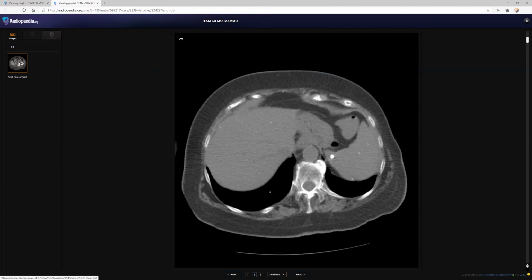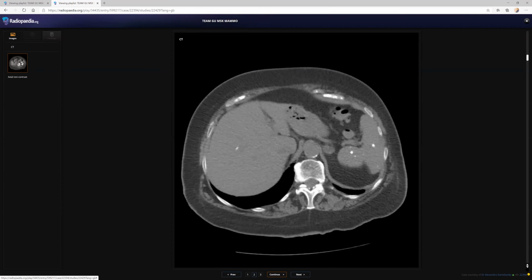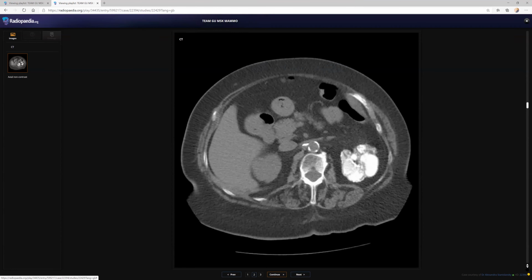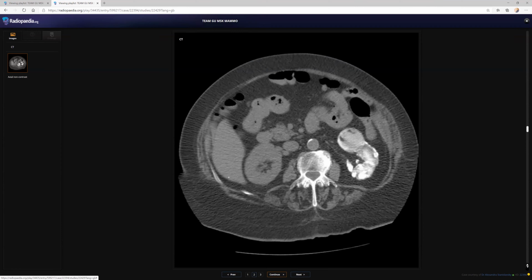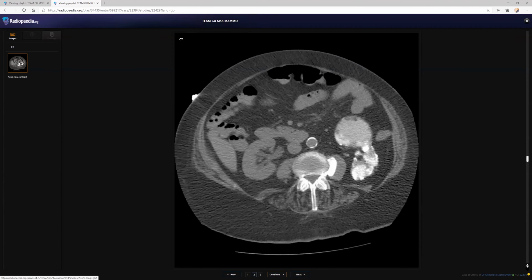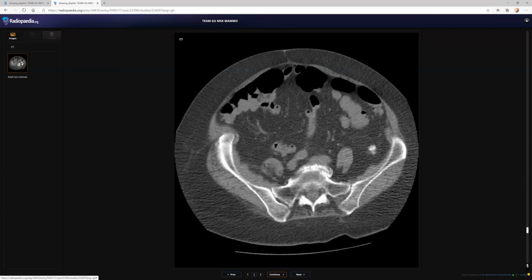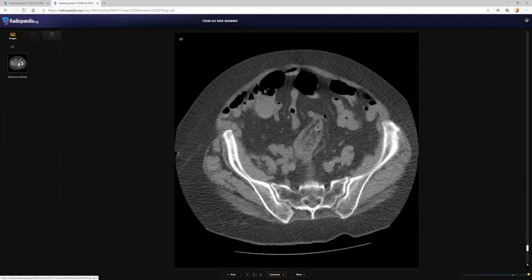Right. So that's the CT axial non-contrast images of the abdomen. I can appreciate there are some calcified lesions involving the liver and spleen. I can also appreciate the irregular calcification involving the left kidney, showing irregular margins. Corticomedullary differentiation is absent. However, no evidence of any perinephric stranding or collection. The contralateral kidney is normal.